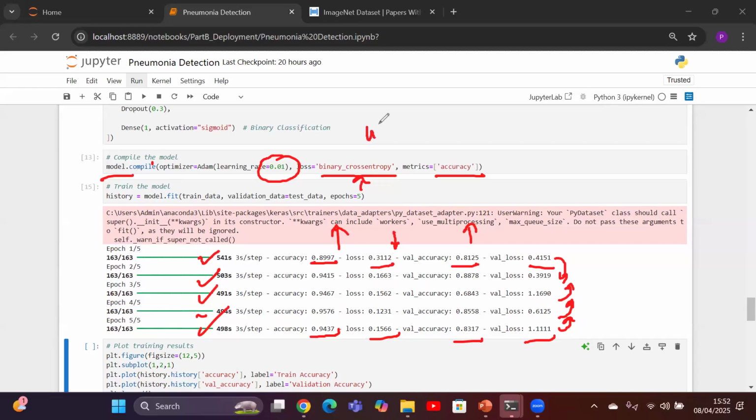Internal values, people will say, very simply, are nothing but weights. That weight is going to adjust and control how the model responds to the input. So this is the importance of a neural network, and we are going to adjust the weights so that we get the best model.